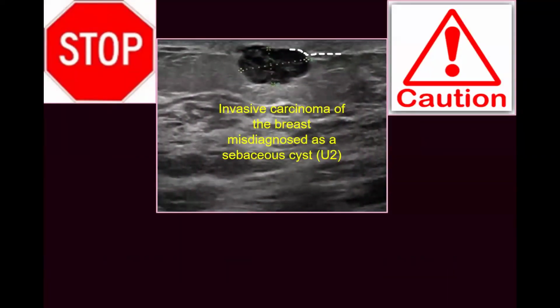We have seen this example. It is hypodermal with the tract extending into the dermis and proven to be an invasive cancer. At baseline, ultrasound diagnosed it as a sebaceous cyst. But look, it doesn't push the superficial fascia posteriorly. It is interrupted, it is cut. Can you see it here? This is the fascia. It is interrupted.